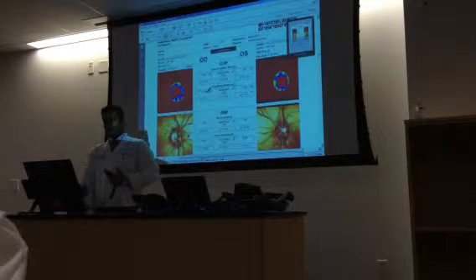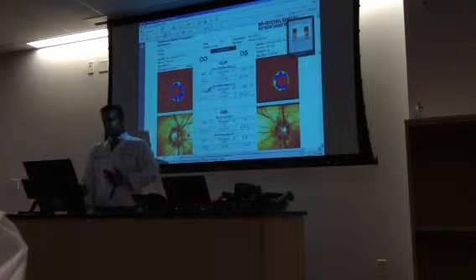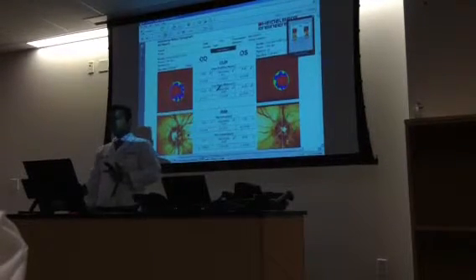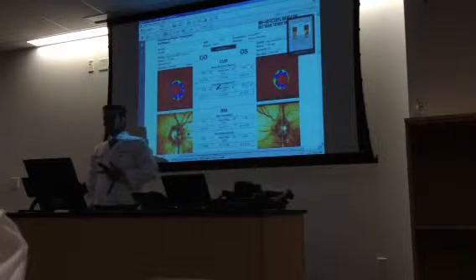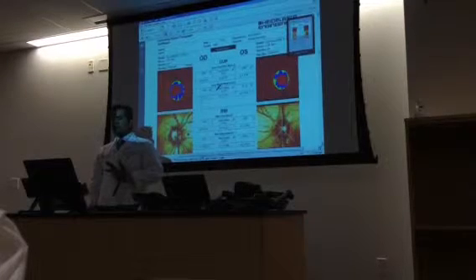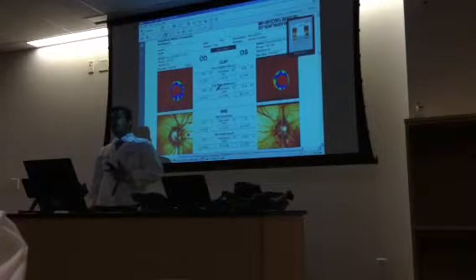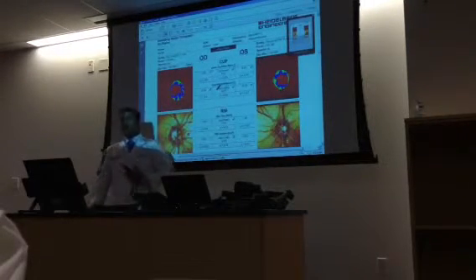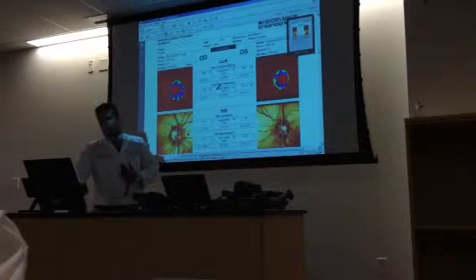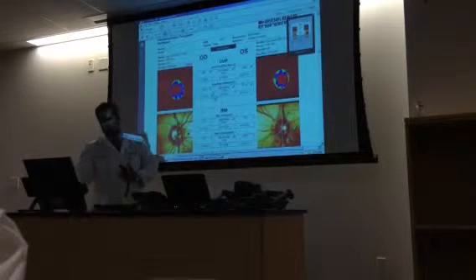And an exclamation point would mean that it's borderline. Cup shape measure is one value representation to tell you if the cupping looks like glaucoma or not. A negative value would signify not glaucoma. A more positive value would signify something that is glaucoma-like cupping.